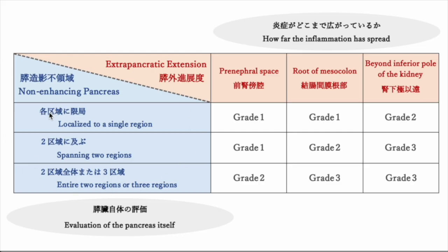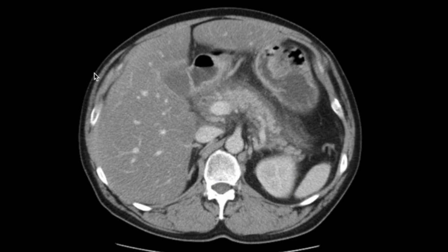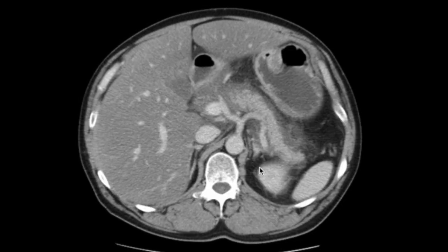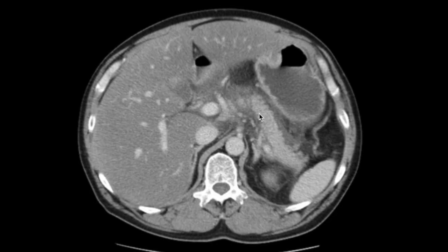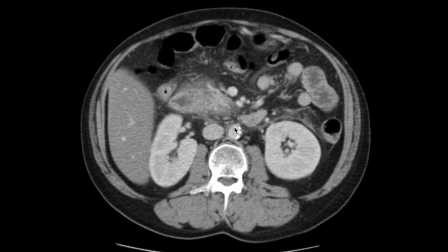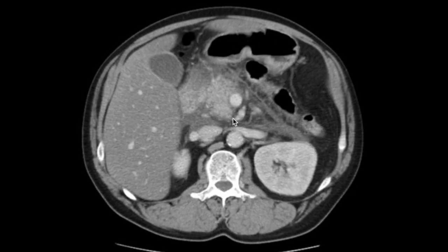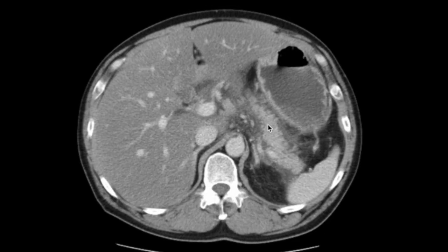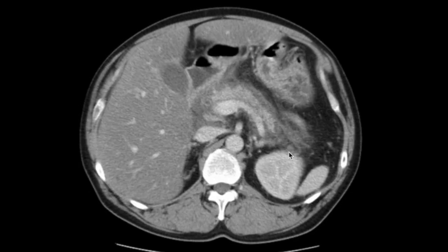In severe pancreatitis, the pancreas can become necrotic. When the pancreas becomes necrotic, blood supply ceases in that region, so contrast agent carried in the bloodstream doesn't reach it. In contrast-enhanced CT, you'll see areas that fail to enhance. Reviewing the CT for this case, there are no non-enhancing dark areas. The pancreas enhances uniformly. Therefore, there is no non-enhancing region and no pancreatic necrosis.